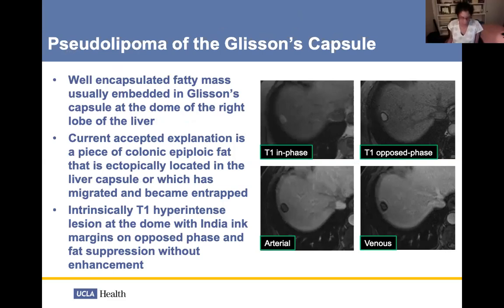Nellie, why do you think you get stuck there between the liver dome and the diaphragm? Why does it get stuck there? I mean, at the bare surface of the liver, it's adherent to the diaphragm, so you can't go in between there. So you're limited by the anatomy. But why does it even go up there? How does it, why does it go up there? I don't know. Why does it go up there? Who's giving you a clue? Who's giving me a clue? Steve? What did you say, Steve? Repeat what you said. Look, he's making a gesture like this.